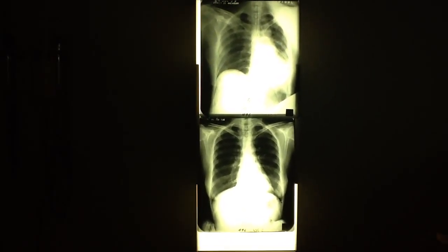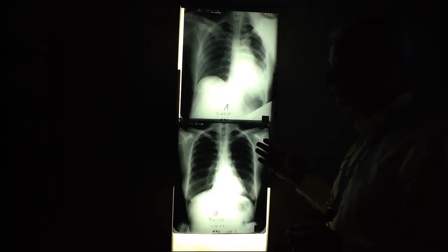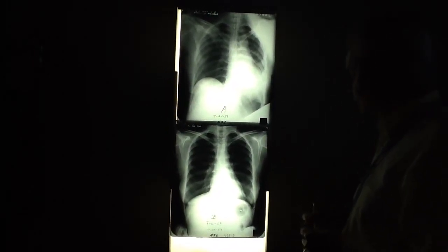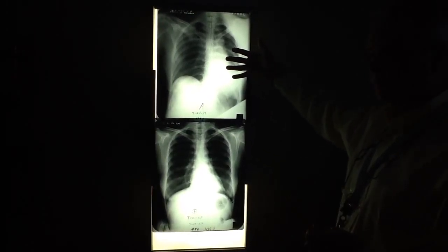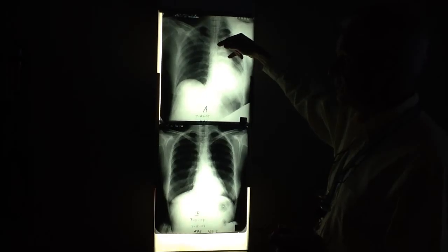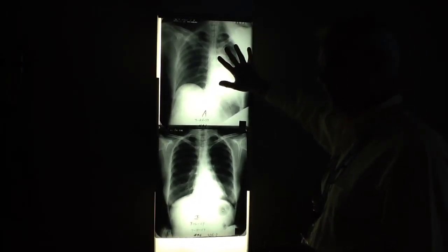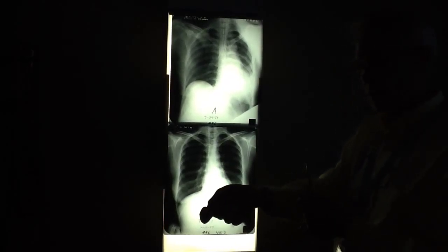A good example of how resorption atelectasis works is this one. Normal, partially collapsing left lung, because they put the tracheal tube in too far, and this is just a placement issue, and that's why they take a chest x-ray of the individual, because they don't know when they're feeding it in how far to go.